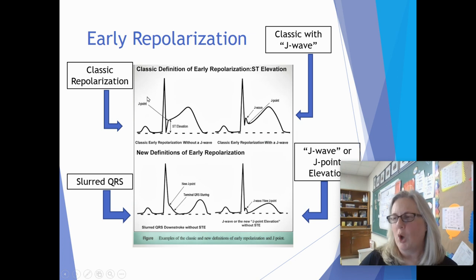So this is what classic repolarization looks like. It is ST elevation, just like we know it. It looks like ST elevation. It's hard to tell, except that if it's an 18-year-old that has this, it's probably not a heart attack, right? That makes sense.